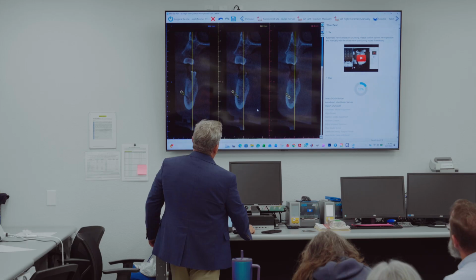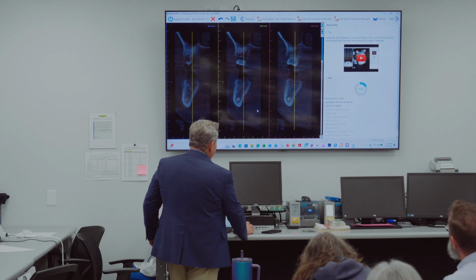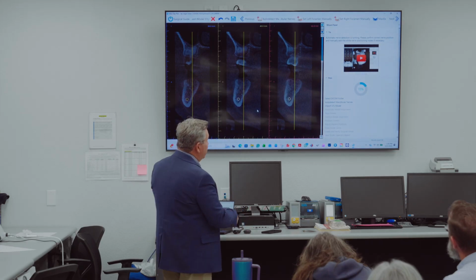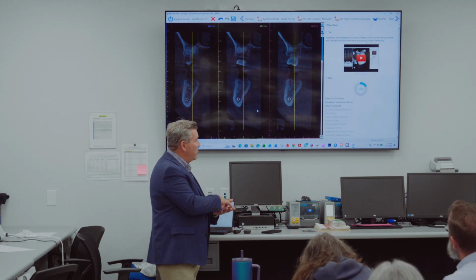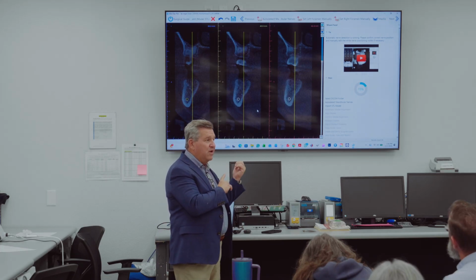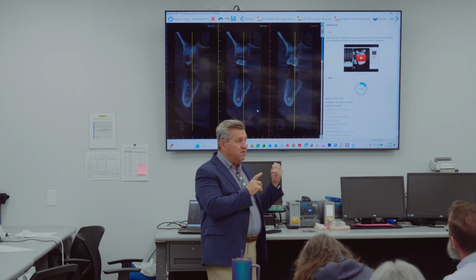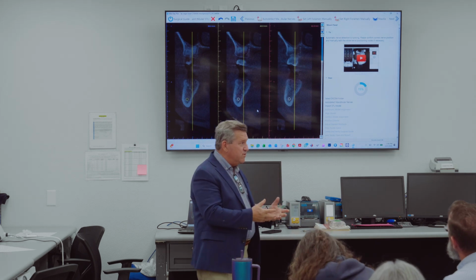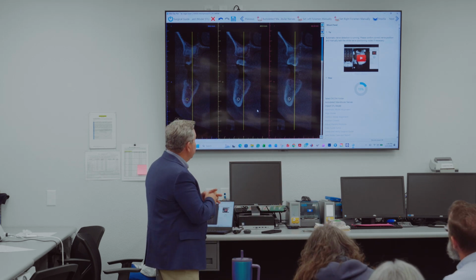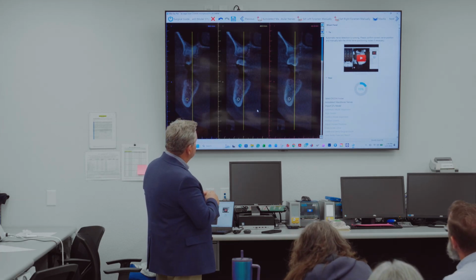Okay, and I think Corey mentioned this, this is very, very accurate. Okay, is it perfect? No. In my lecture, normally I would have given you probably four pieces of literature that support how good AI is, but it still needs to be checked. Okay, it's still not the perfect solution. It's really close. We're getting better every day, but still you're ultimately responsible. So check it. Okay.